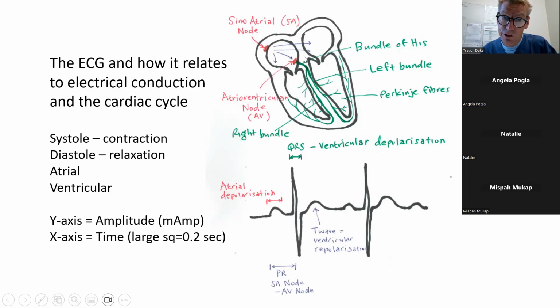So if you've got right atrial hypertrophy, a really thickened right atrium, then you'll have what's called P pulmonale, which is a peaked P wave. It'll be more than 2 small squares in height. And if you've got mitral hypertrophy, left atrial hypertrophy, I should say, then the P wave will be prolonged, right? And so there'll be what we call P mitrale.